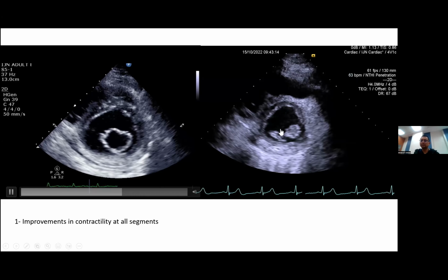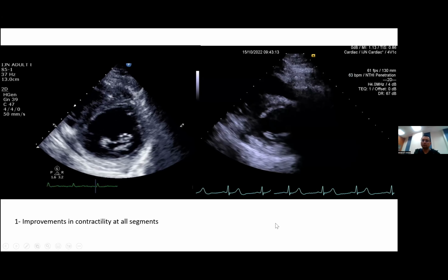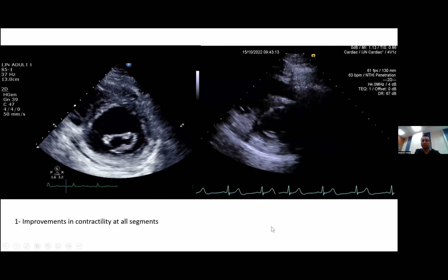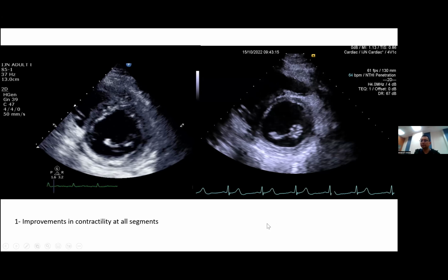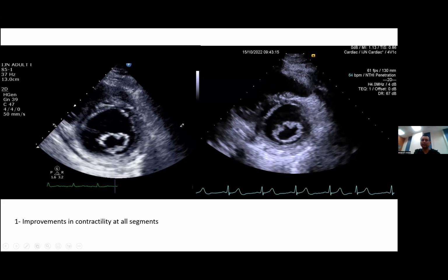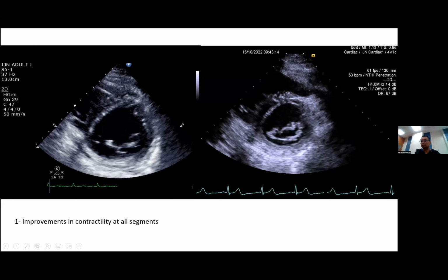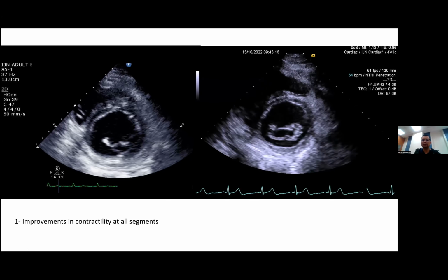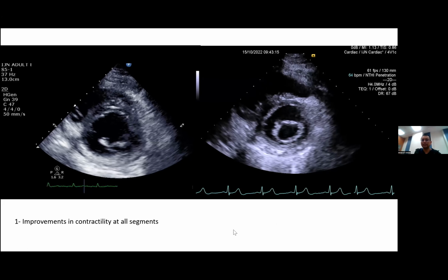But the reason I stress this one is because a lot of doctors or the new cardiology fellows sometimes find it very difficult to name the left ventricle wall, especially when they look at the short axis view. So I just wanted to give a tip on how to simply name the left ventricle wall by using a certain marker as your baseline.